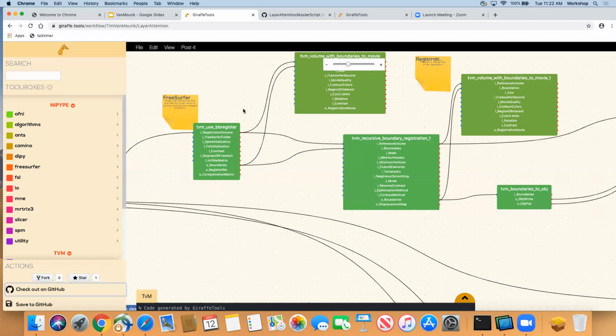Basically, with a boundary-based registration, you take your functional data and your anatomical data, but only the surfaces that FreeSurfer generated on the anatomical data, and try to map them to the same space as best as possible. What you haven't figured out then is that if your functional data is slightly distorted because of the EPI readout, they might not overlap perfectly.